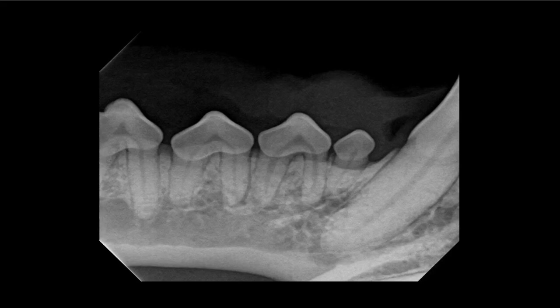I wouldn't say that there's changes yet around the root tip, but that would ensue if it's not already starting and we just can't see definitive evidence that it's there. I would say probably what changes are there would be impossible to differentiate from bone changes that are superimposed around that tooth root. So I would not be able to call that by any means.